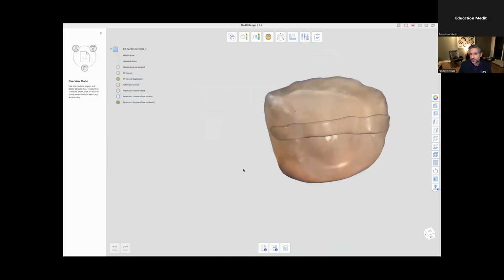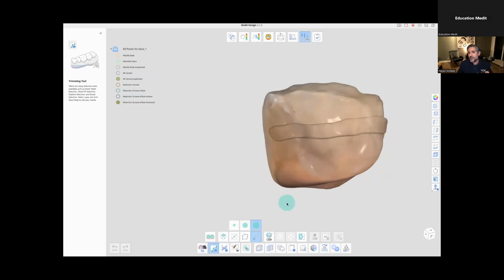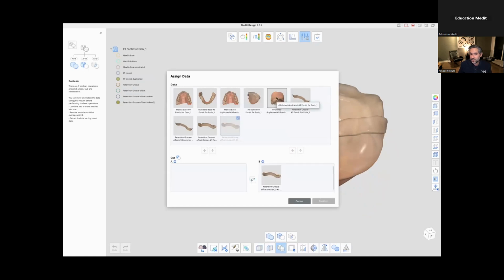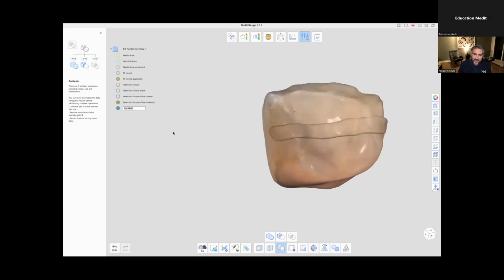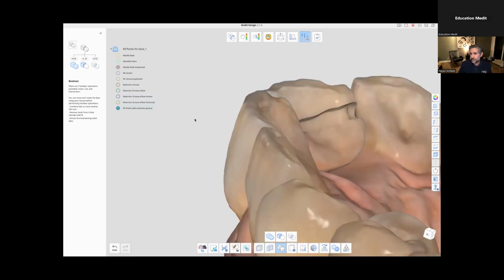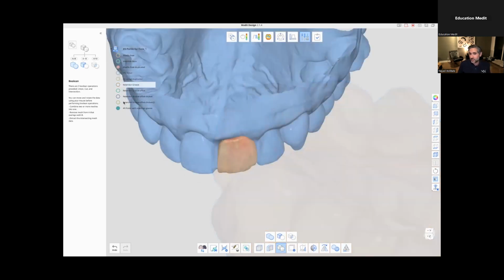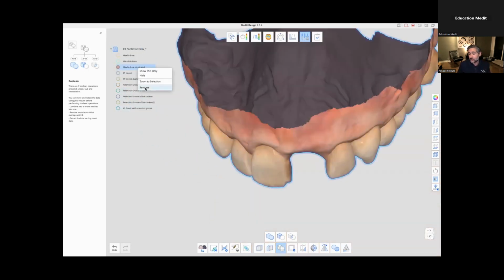And if you look at this on top of your Pontic, you can see that you've offset it and you've thickened it. So what I'm going to do is use the Boolean cut and take B away from A. So I'm going to take that area and cut it away. And you'll see that what we have now is the resulting remaining Pontic with a retentive groove cut right in. So I have to do very little finishing. I can make my Essex. You can also bond it into your Essex tray, but I don't find that's usually necessary with this groove.